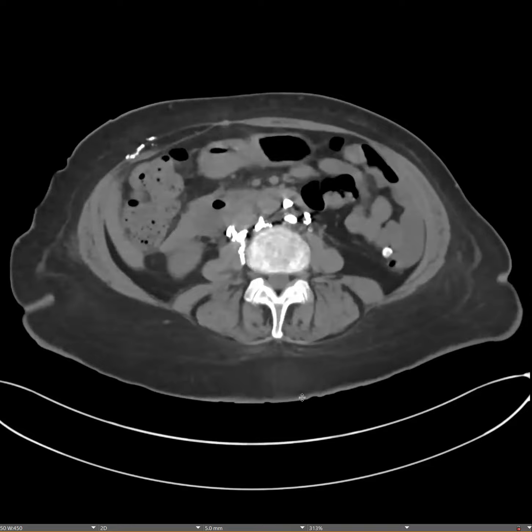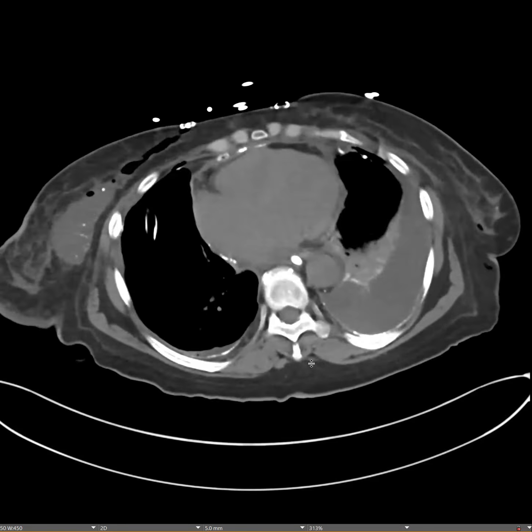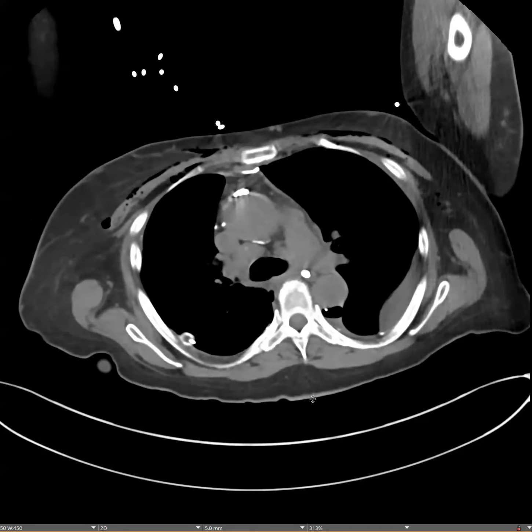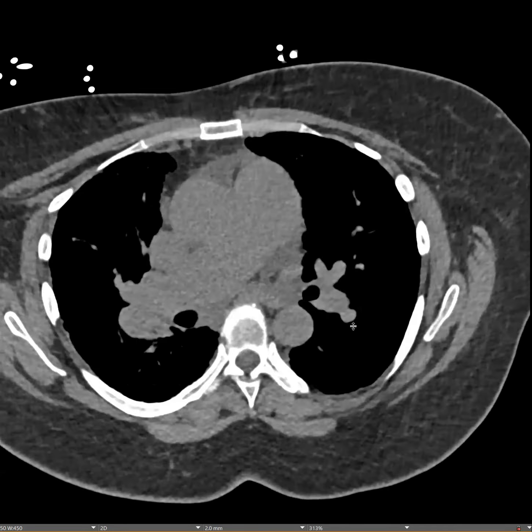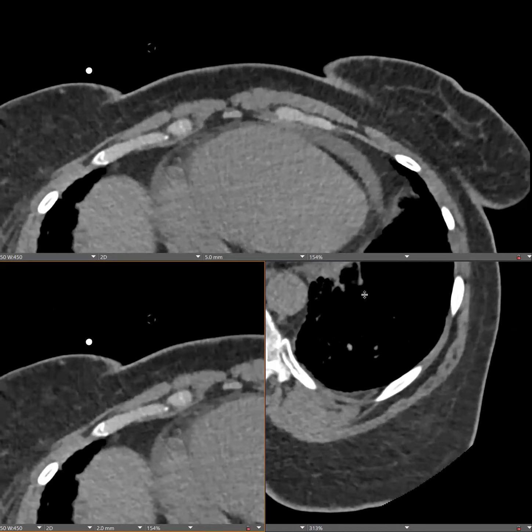So they've had a prior lymphangiogram. Yes, because there's lipiodol in their lymphatics. I'm thinking maybe they had a chronic chylothorax and then had to embolize it? Yeah. Initially, when the resident put in the report, they said multiple calcified lymph nodes in the chest, abdomen, and pelvis from sarcoid. But we checked, and a CT chest from 6 months prior did not have all those calcified lymph nodes.